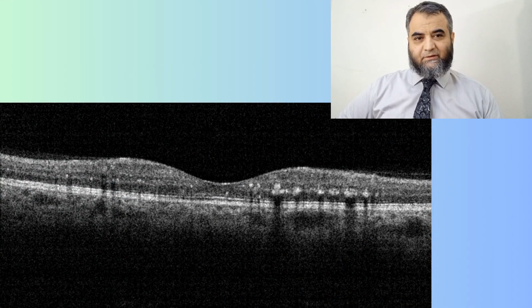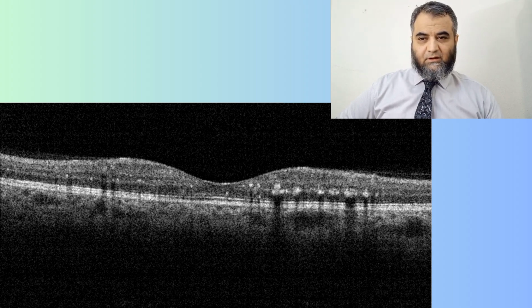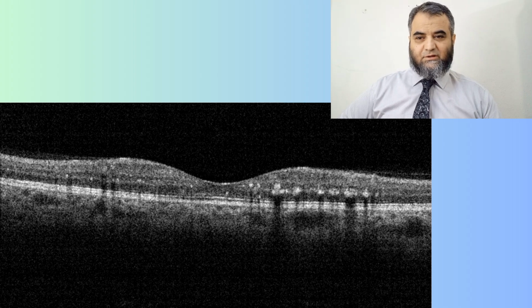After laser treatment, as we showed you in the earlier slides, the macular edema has settled down. It is shown in this OCT. There is no more intraretinal fluid, no more subretinal fluid. But on the right side, these white dots basically are the remnants or dispersed hard exudates. It is showing the hyperreflectivity intraretinally. Otherwise, there is no fluid or edema, and things have settled down.